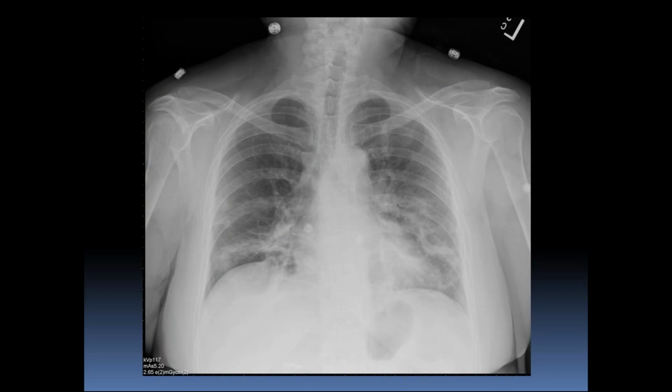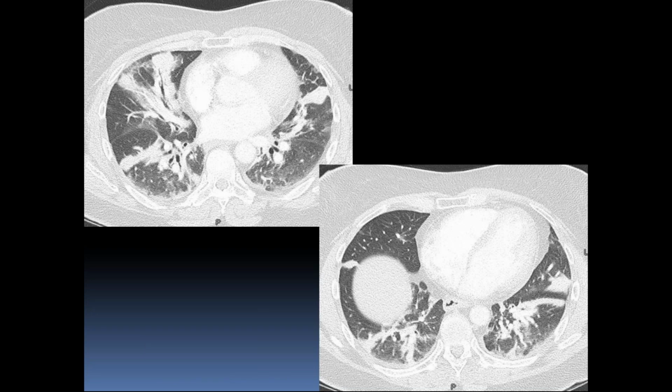So, this next picture, we have some opacities within the lung bases bilaterally. And I'll give you a little clinical history with this: the patient had a persistent cough and was post-Avelox therapy, a bit of antibiotic. So what we have here going to the CT is consolidations. Where are the consolidations? Again, location. We're looking at a pattern. This is a peribronchiovascular distribution of these consolidations.